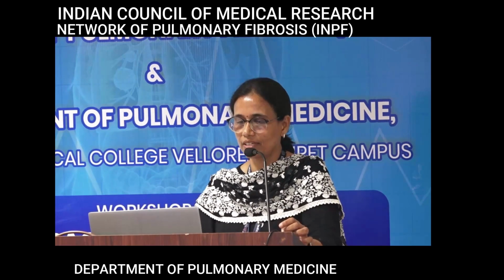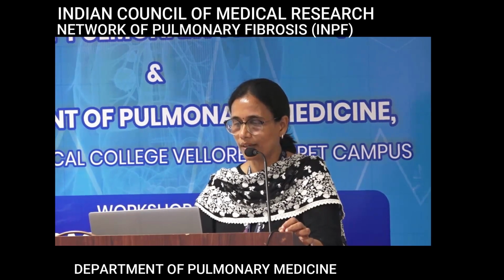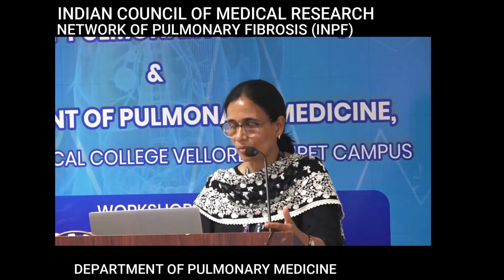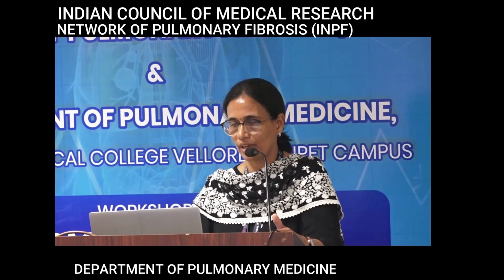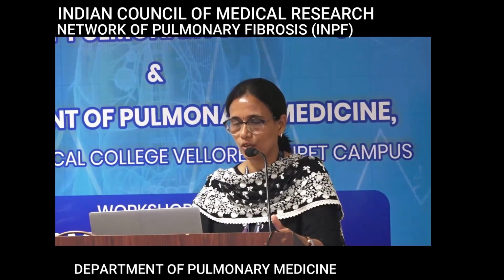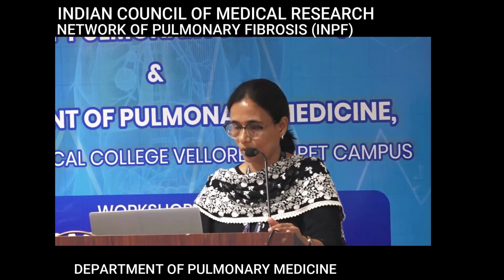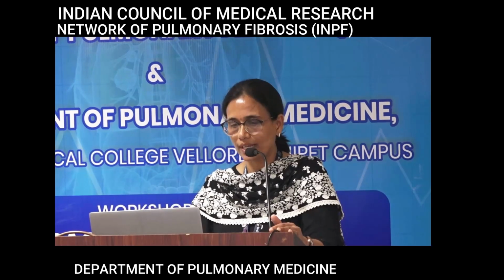This is a patient with pigeon exposure. What do we see here? We are seeing ground glass, and again these lobular areas of air trapping, and there is not much fibrosis. So this is a non-fibrotic hypersensitivity pneumonitis. Again, we have the typical and compatible categories in that. You will be going through this, so I'm not going into details.